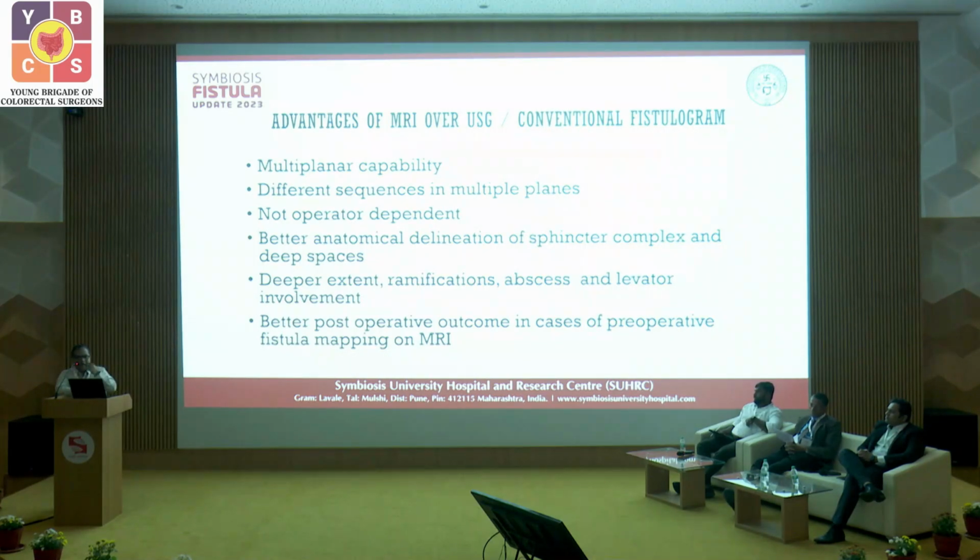As we already say, cross-sectional imaging, whether CT or MR, is a boon for mankind because we can see through what our naked eyes, or what a surgeon or clinician, cannot see. We are trying to help you identify the complex anatomy.